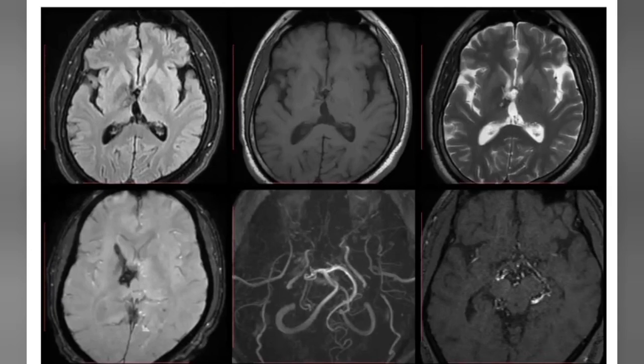They are hypo on... They are present in the left and right frontal lobe as well as in the bilateral thalami. They are hypo with internal hyperintense area in the FLAIR images, and the same intensity is also noted on T1 weighted images. On T2 weighted images, they are hyperintense mainly.